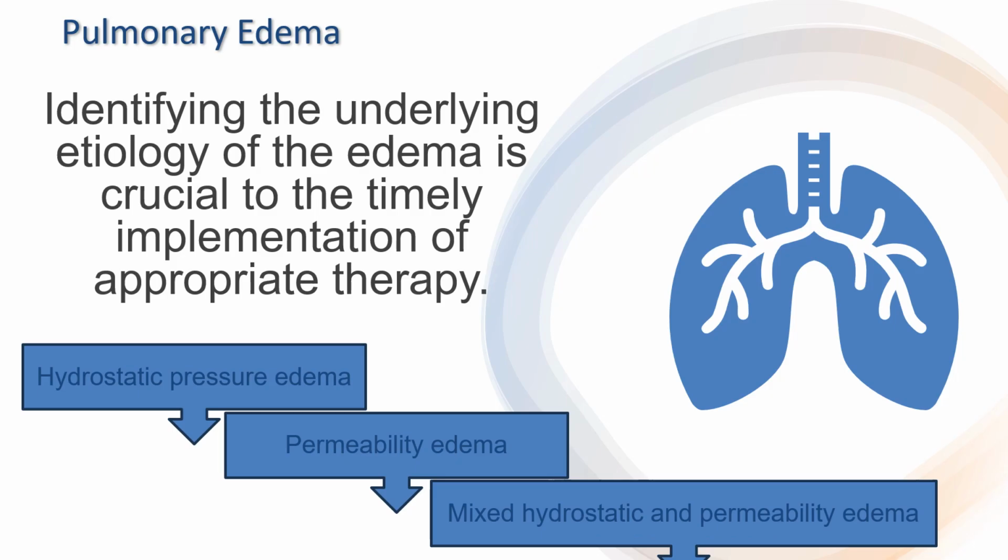Pulmonary edema is one of the most common emergency conditions, presenting in almost every emergency department. So identifying the underlying etiology of the condition is very crucial to the appropriate therapy for the patient.